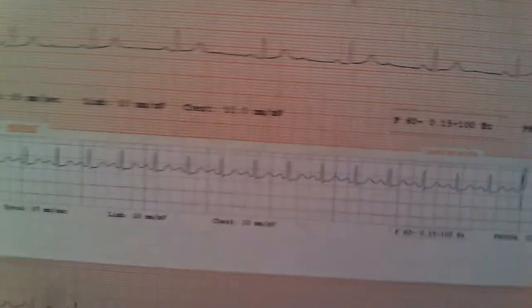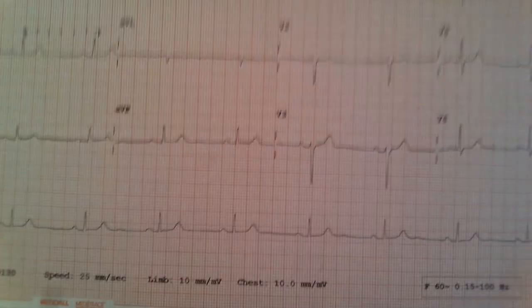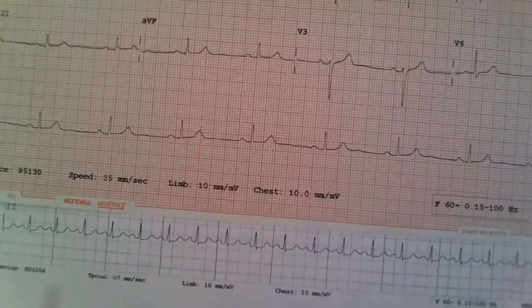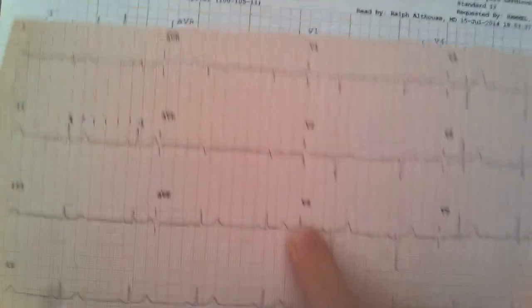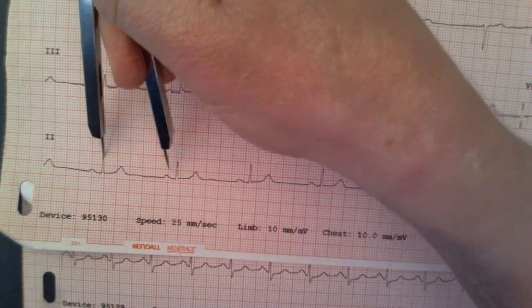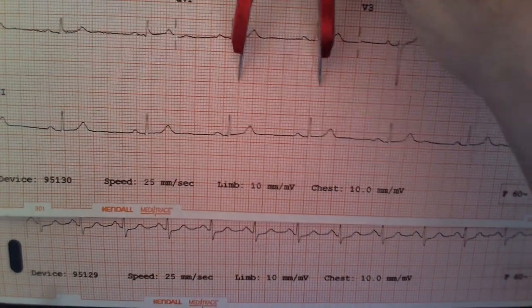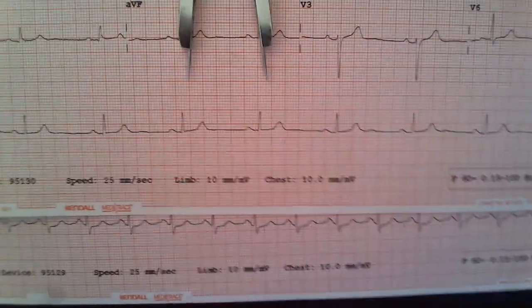Now I'm going to bring one in that's slower. You can certainly tell that this EKG here is slower than the one below it. There's a lot less QRS complexes than in the prior ones. So again, we're going to just look at our whole EKG. We see all of our leads. We'll grab something from down here, lead 2. Open up our calipers. I'm just using calipers because it's easier for me when I'm demonstrating. And I'll do it this way so you guys can see.